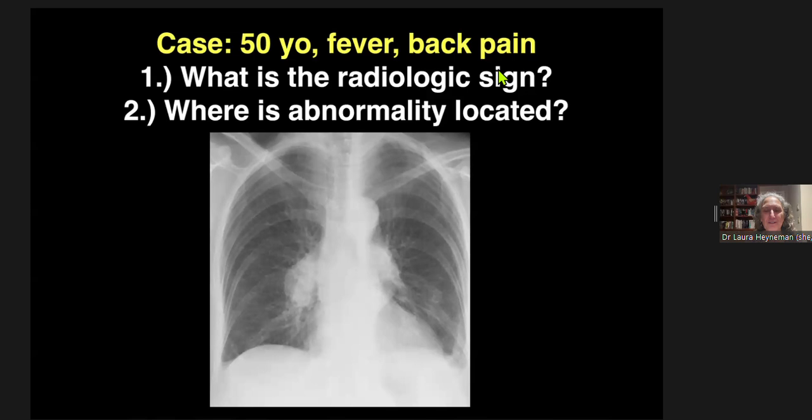Okay, this is a person who comes in, has fever and back pain. There is an abnormality. My question to you is, what is a radiologic sign that we are seeing, and where is the abnormality located?